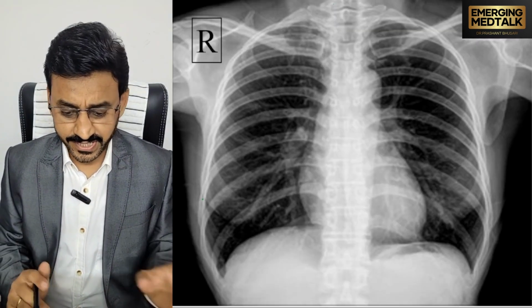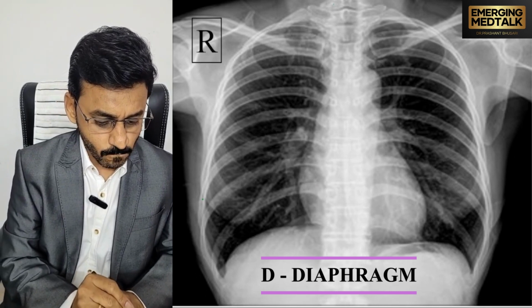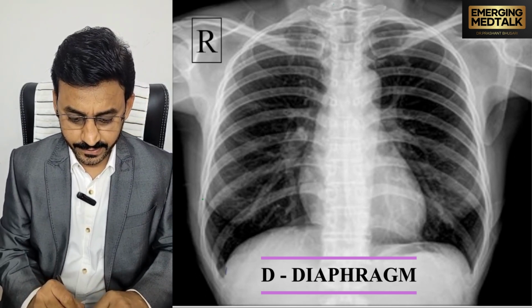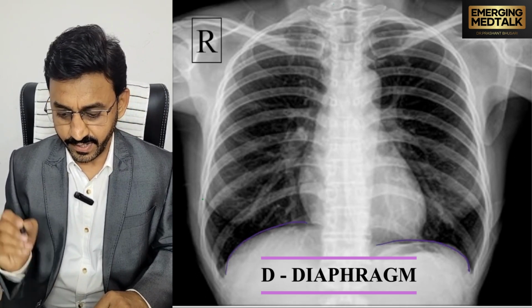After this cardiac shadow, we will discuss the diaphragm. Here is the right hemidiaphragm and here is the left hemidiaphragm.